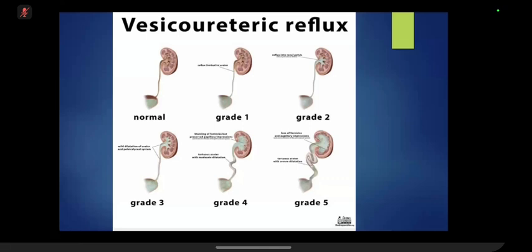All these usually present in a similar manner, so try to see if there are additional ureteroceles or a diverticulum, as in this case, where there was a Hutch diverticulum. These findings are also important when you are presented with such cases in the exam. They will get you very good marks.